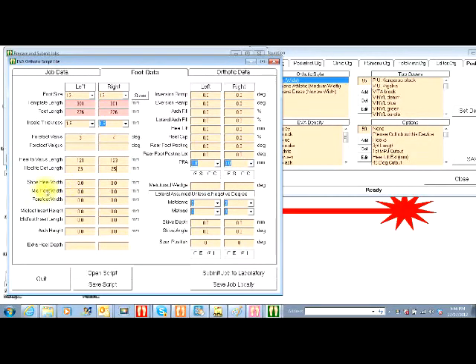Shoe heel width, mid-foot width, and forefoot width. Once we've got the block of the EVA and we've finished shaping the top of the foot, we then grind it in so that it sits to the base of the shoe. If the podiatrist doesn't have a grinder on site, they get a pair of calipers and measure the shoe, and that tells us what angle they want us to grind it in.